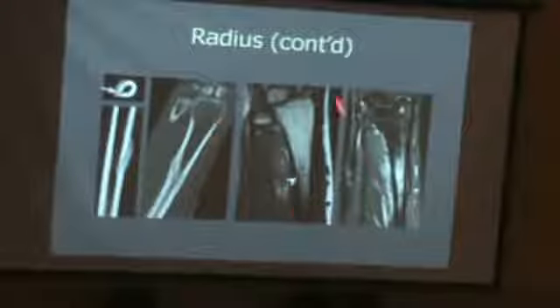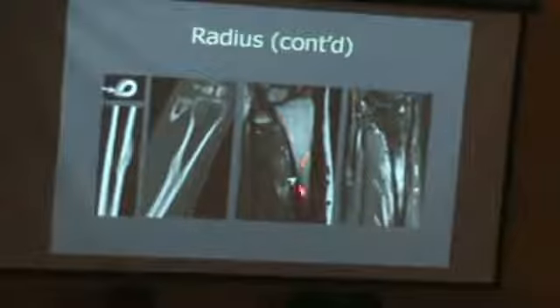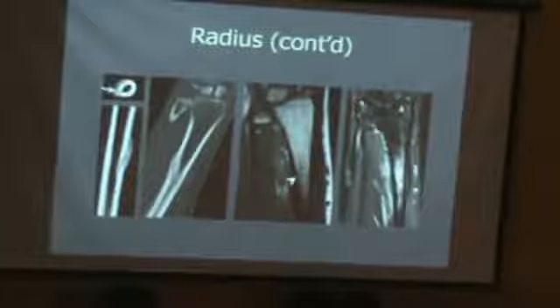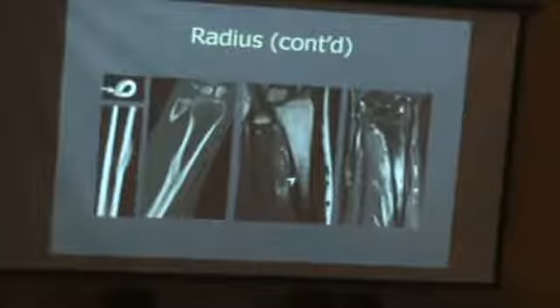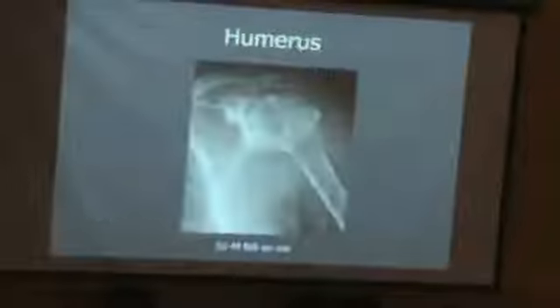And second of all, we've done an MRI. Again, really, T1 weighted, non-fat saturated is very important. You see the line here. You see the soft tissue edema as well. You see it on T2 better. And you see a big, large, acute hyperintensity, indicator of bone marrow reaction, which is acute. So again, by CT scan, you see that the cortex is very thick. You see that there is a very thick periosteal reaction. So it's really a chronic kind of fracture superimposed with an acute fracture.